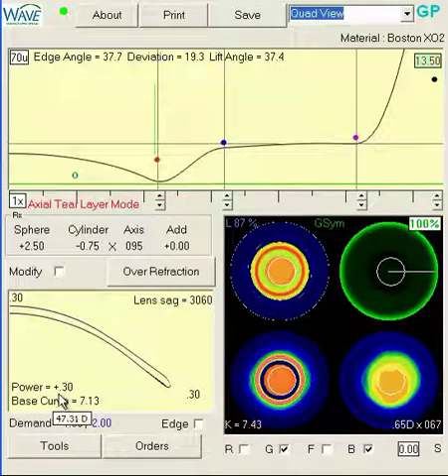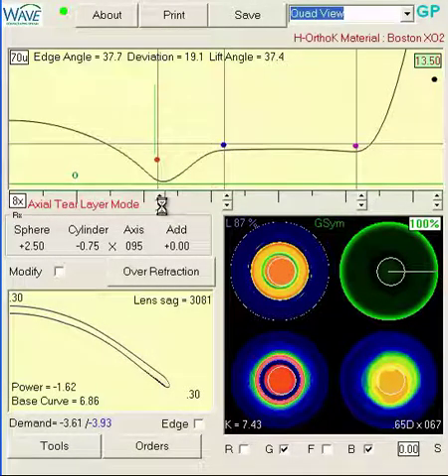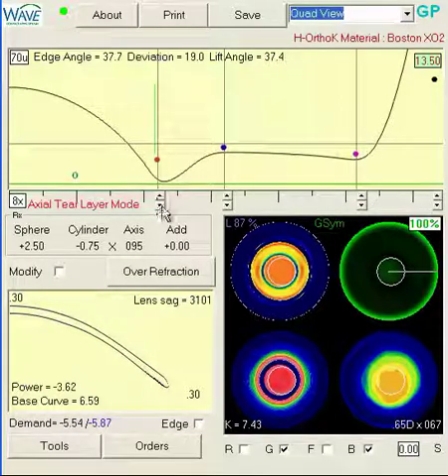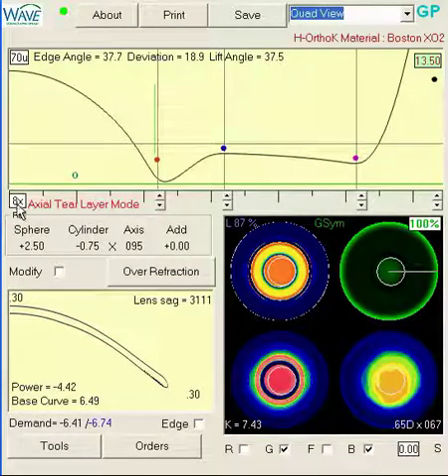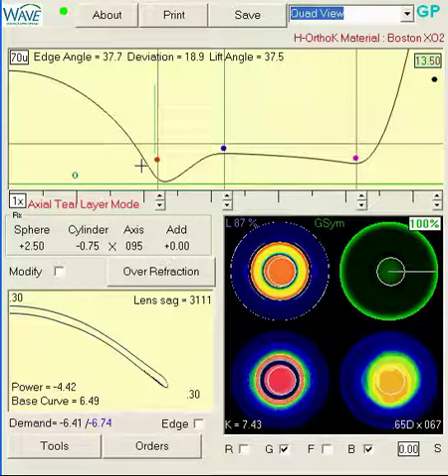We were originally at a minus 268. For a plus 250, where we want a little bit more for monovision, I think our demand is going to have to be around 450. So in 100% mode, I would just click down until we're there. So we've got quite a bit of central clearance, 56 microns.